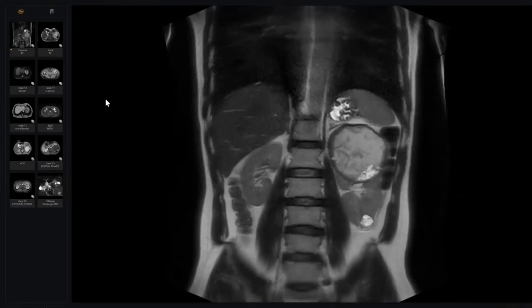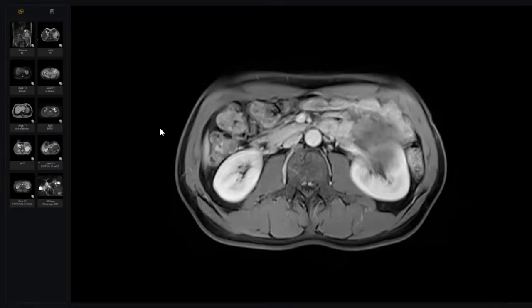Okay, sir. On the left, in the lower pole of the kidney, there is one more cyst noted. The cyst also shows some hyperintensity. The upper pole cyst has some hyperintense signal as well. So it could be hemorrhage, sir. Please have a look here. Please look here.